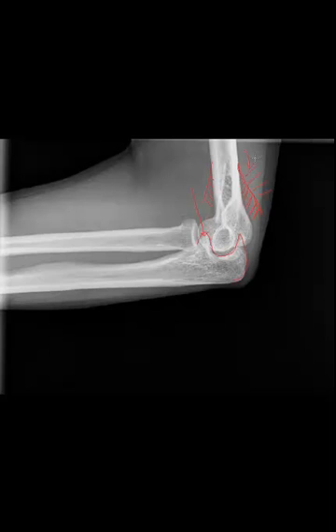Now, if you see this, it means that there is an effusion in the joint, and there most likely is damage to some structure within the elbow joint itself. Oftentimes, you will need an MRI to evaluate that finding if it's not conspicuous on the radiograph. So the posterior fat pad is a nice indicator that there is some internal derangement of the joint, even if it cannot be seen radiographically. So just be sure to look at the soft tissue in this region. I think we've covered most of the anatomic structures here.